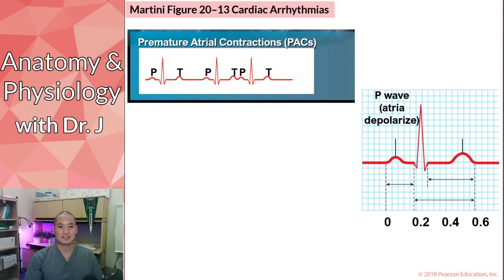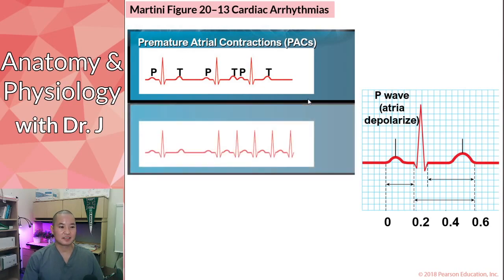So PACs sometimes happen, and it doesn't mean you have to go to the hospital, but if this is something recurrent or something that hasn't happened in the past, maybe your doctor might look at your EKGs more and monitor you a little more on the long term. But yeah, so that's what we have here. Premature is kind of jumping the gun. Now let's look at this.